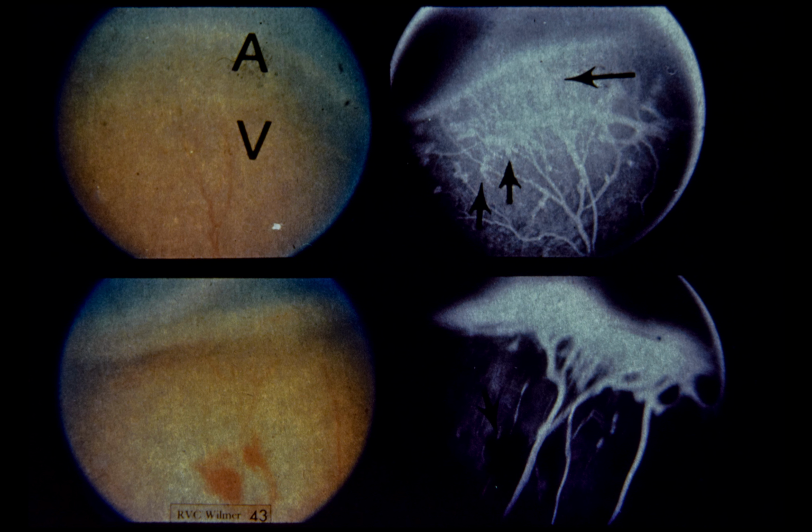Upper right, fluorescein angiography provides better resolution of neovascularization. Short arrows show nodules of neovascularization. Long arrow points to vessels which have extended past the zone of neovascularization. Flynn and co-workers have suggested that when retinal vascularization penetrates this demarcation zone to vascularize the retina more anteriorly, spontaneous regression has started. This has also been our experience in several cases.